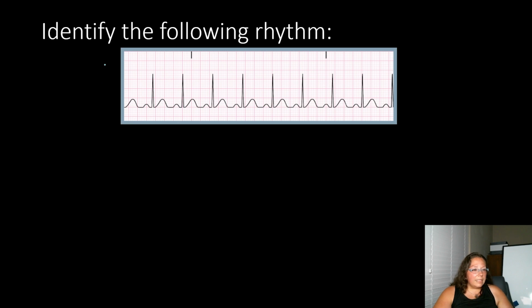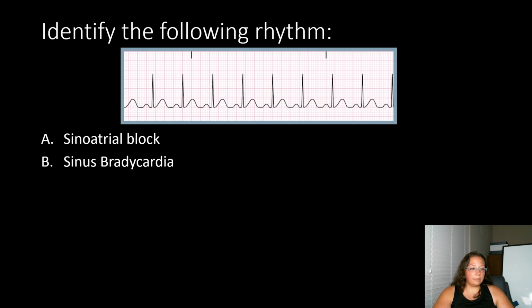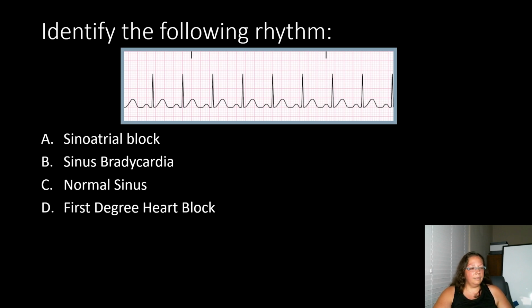All right, identify the following rhythm. Sinoatrial block, sinus bradycardia, normal sinus, first degree heart block. Okay. Do we have P waves? Yep.